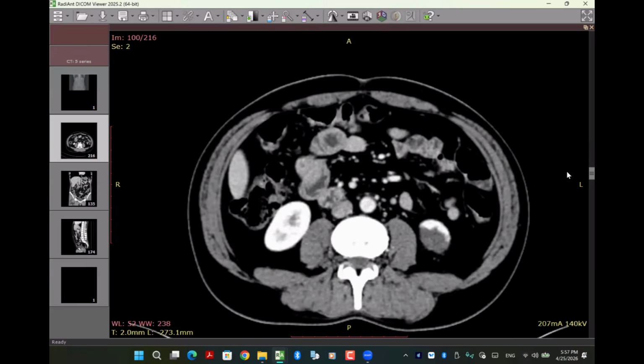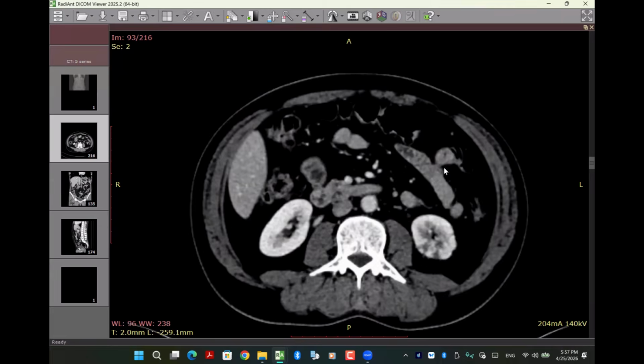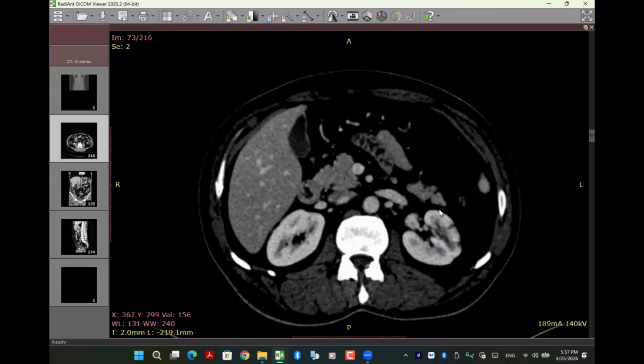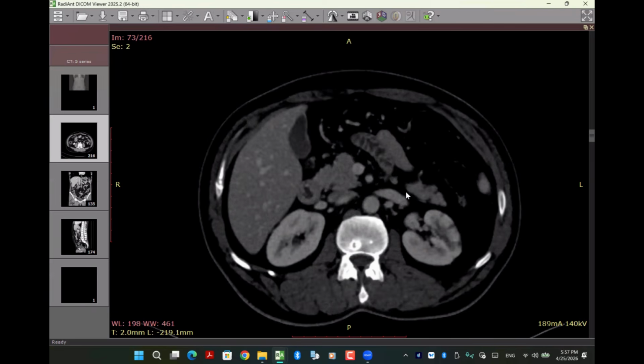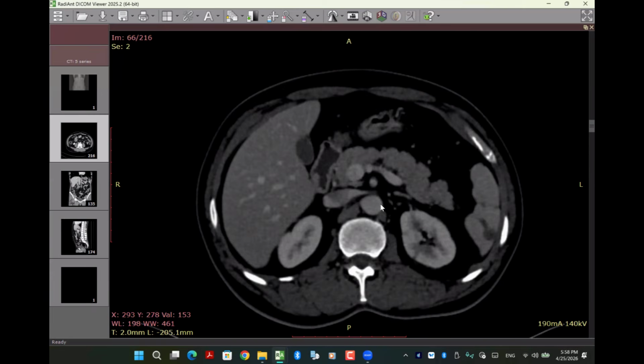Another possibility for this one can be polyarteritis nodosa, but that won't explain the splenic finding. Exactly. And that is more likely to be bilateral. Okay, nice. So you are dealing with a case of renal infarction and splenic infarction. You describe it very well. Cortical hypodense region, plus the striation. You did very well, and also you commented on the other side. But this one actually is more or less going to the nephrographic phase, not exactly the corticomedullary.